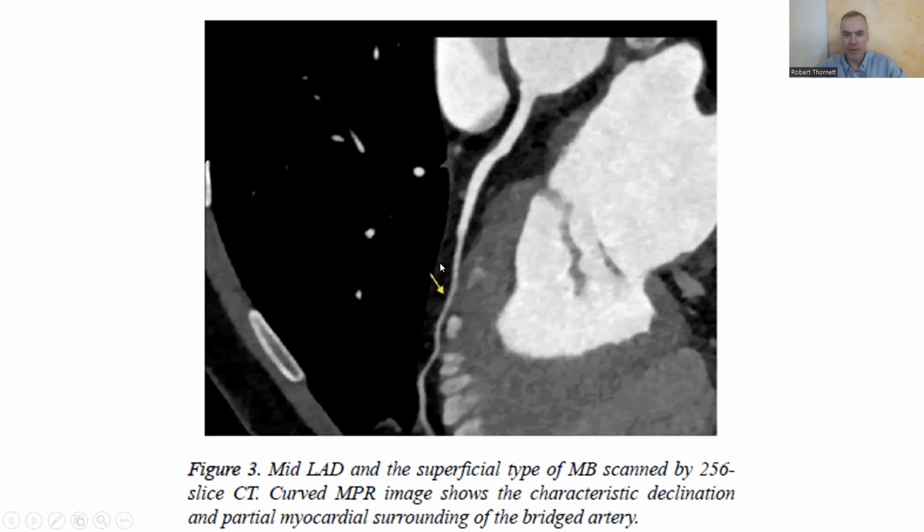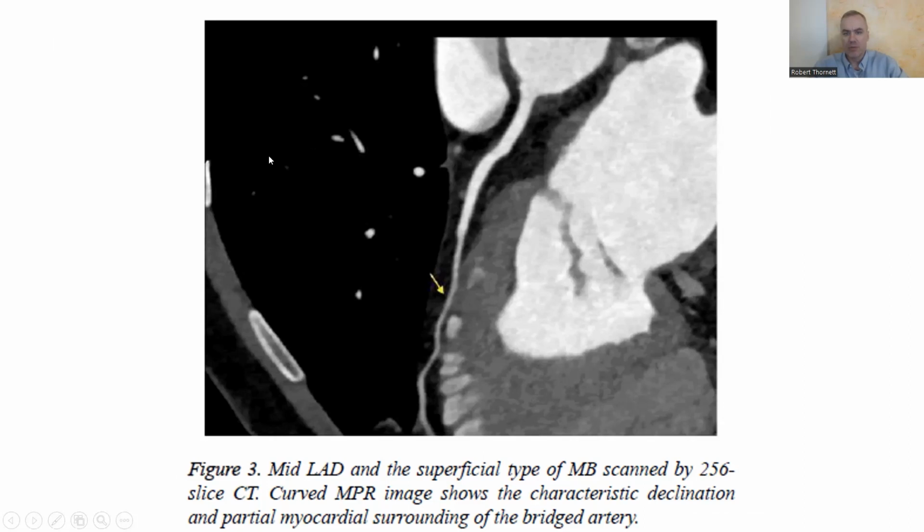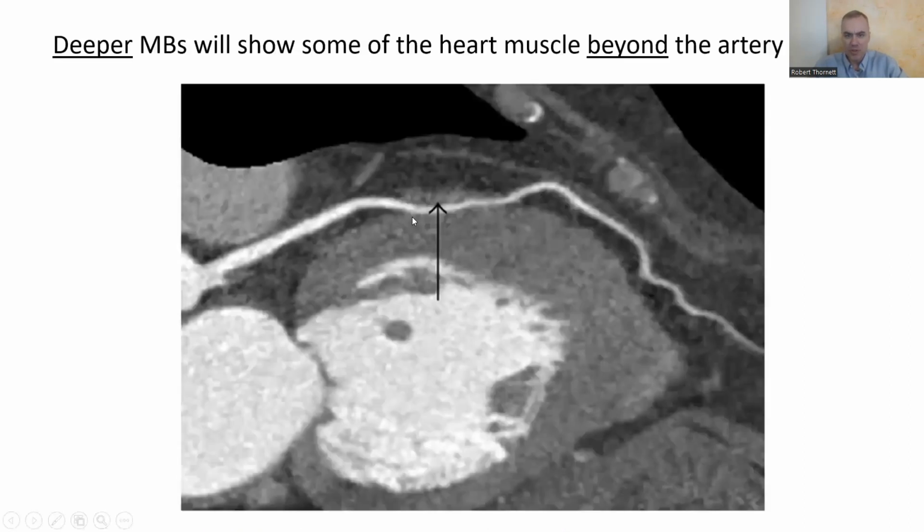There's something else we haven't talked about yet, which is this. So this one is a little bit shallower, it looks like, than this one, because this one here is shorter. But notice that here's your heart, the gray stuff, and then here's the black stuff. Okay, and it ends right there, and then the black fat ends right there, then it goes gray. Okay, and it's abnormally narrow, it's fuzzy. So we get all three elements: the fuzzy blurriness, the narrowness, and then the black fat disappearing. But there's this other thing which tells us it's probably on the deeper side, and that's that.